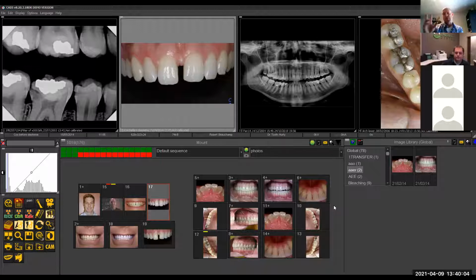If you think of it like a franchise mentality where you're trying to set up this protocol in every room, which is how you should do it, it will be like that in every op. So they'll get that sequence down, take the picture, take the card out, put it in the reader, hit import, and it'll go and read that reader right away. And then every room will be set up like that, exactly the same thing on every station. And then you're flying.